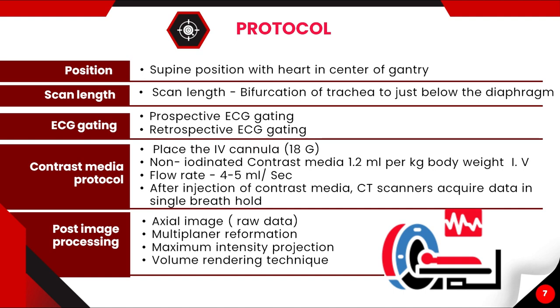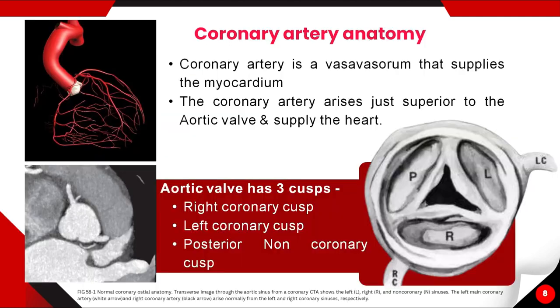The post-processing coronary arteries are reconstructed in axial images, multiplanar reformation images, and maximum intensity projection and volume rendering techniques. Move on to coronary artery anatomy.